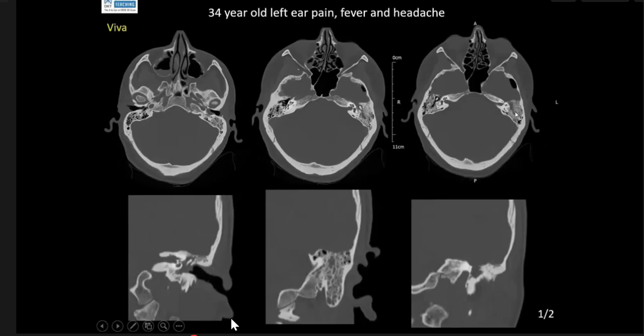I believe there is a bony erosion of the ossicular chain, because I can't see the ossicles now. I would like to take this further by having an MR done. Yes. So now the key point here is, and it is a classical exam case. You picked up the locule of gas very well.